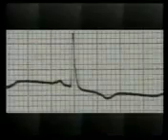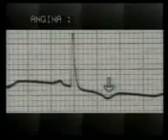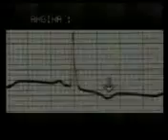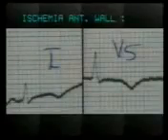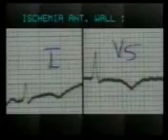If the inverted T waves are seen in patients without acute chest pain, they suggest myocardial ischemia, and their location tells the area of ischemia. T wave inversion seen here is in lead V5. This is typical of chronic angina. This ECG shows T wave inversion in 1, aVL, V5 and V6. It indicates myocardial ischemia in the anterior wall, probably narrowing of the anterior descending branch.